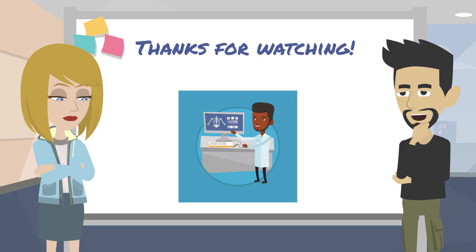Remember, X-ray rooms have specific equipment that each serve purposes. Once you understand what each one does, the better you will be at performing X-rays.